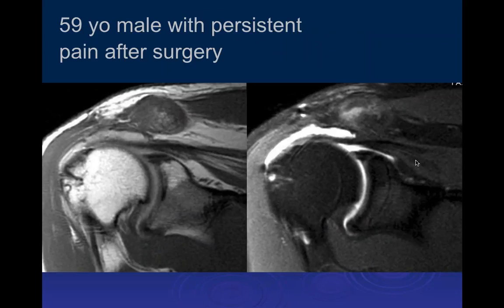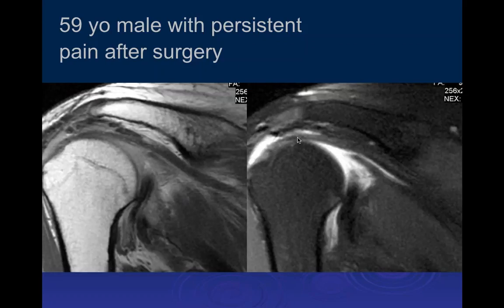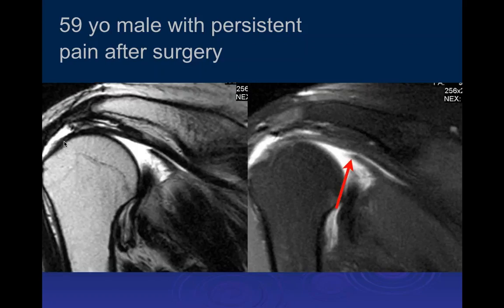Here's another case where we see the musculotendinous junctions way back here, distal end of the tendon somewhere in here, and this is all scar in situ, and we can see fluid going through the defect here. And just more examples of scar in situ, complete tendon tears, proximal retraction, and this development of scar in situ that you just need to be aware of. That's actually the distal end of the tendon, and this is all scarring in through here.